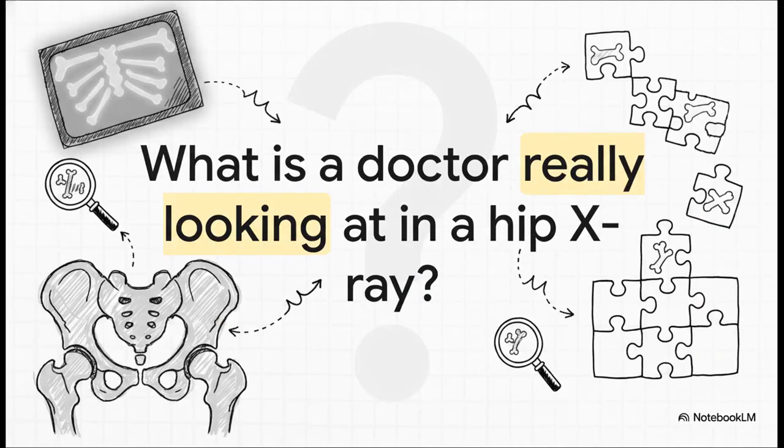You've probably seen a hip x-ray before, right? It can look like, well, an indecipherable puzzle of gray and white shapes. But what if you could actually read it? What if you knew exactly what a doctor is searching for? Well, today, we're going to start decoding that puzzle, piece by piece.